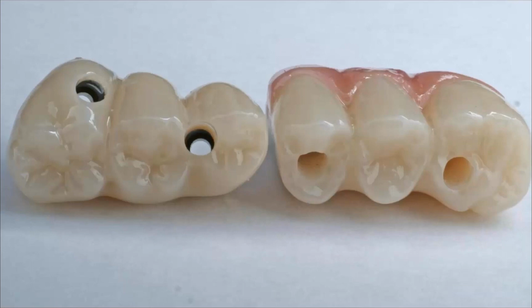And, you know, I think a lot of us who have a lot of experience doing freehand implants would argue that we would not end up with a result that we see on our screen left. However, would we necessarily end up with a result as good as what you see on the right? And the answer is maybe, maybe not. So how do we get to that result that we're seeing on the right-hand side? Let's talk about the entire workflow. And I'm going to talk about the software strategy and solution that we use to bring it all together.